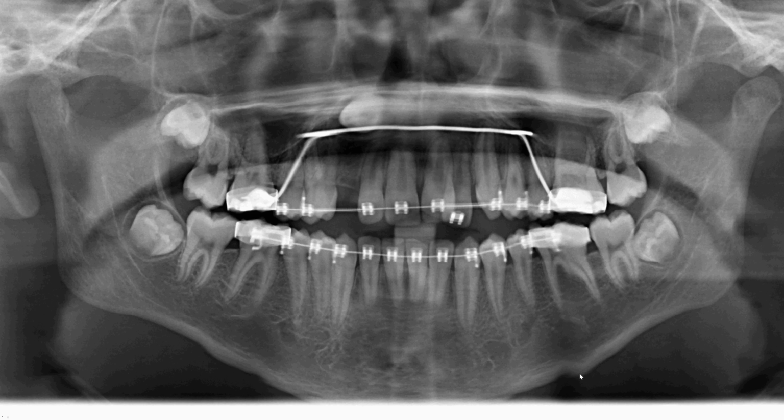I hope you found this to be interesting. This is a unique, atypical artifact that we don't normally see at our clinic because we do such a great job of making sure the patient does not move during the scan. But this was an image that was imported from the outside.